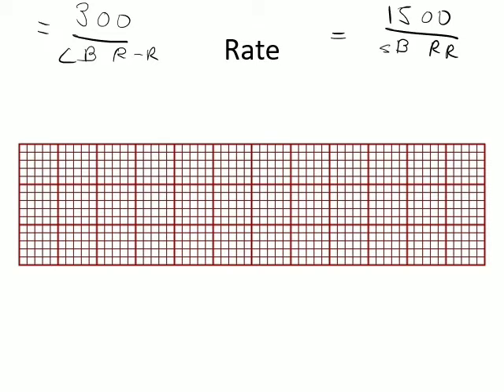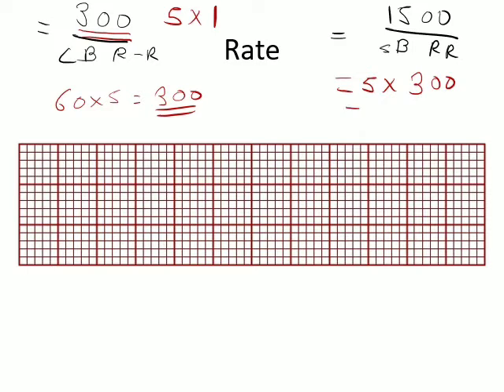It's very easy to remember them because, as you might remember, 5 large boxes is equal to 1 second. So a minute consists of 60 seconds. So 60 times 5 is equal to 300, which tells us the number of large boxes that will be there in 1 minute. Similarly, one large box consists of 5 small boxes. So 5 times 300 gives us 1500, which is the number of small boxes in 1 minute.